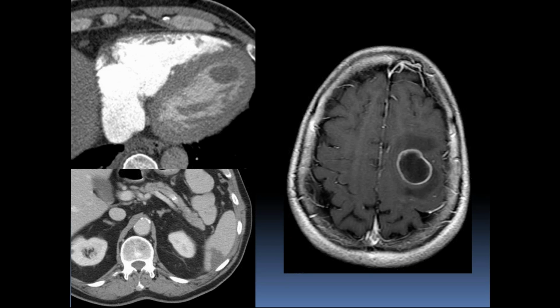High-res chest imaging is exactly the same way. You have patterns like that in the spleen. You have locations. Is it going to be in the upper lobes? Is it in the lower lobes? Or is it diffuse? And then you can correlate it with the history and find out what's going on. And then you can narrow down to the greater differential.